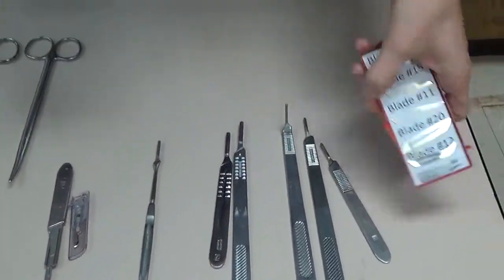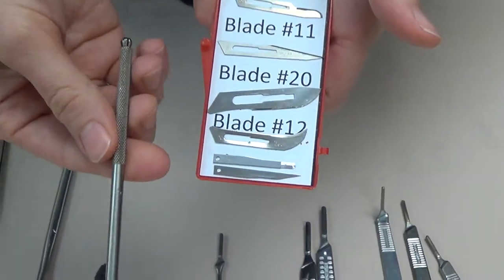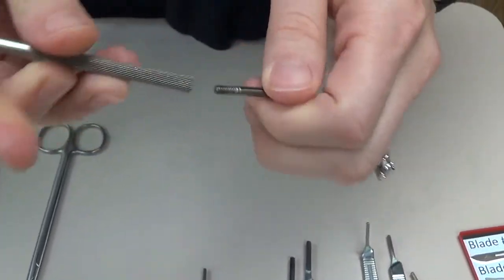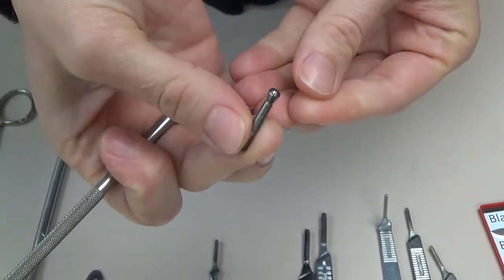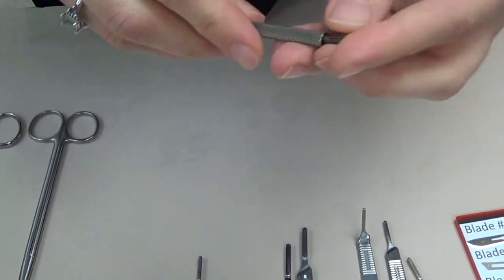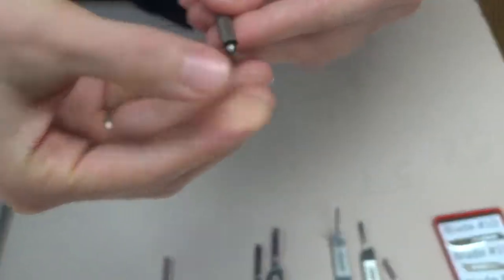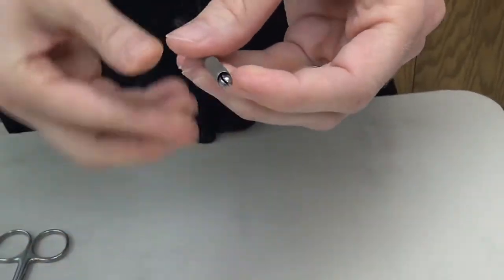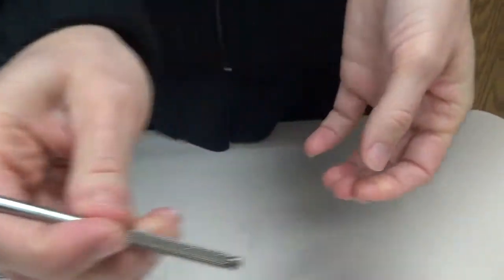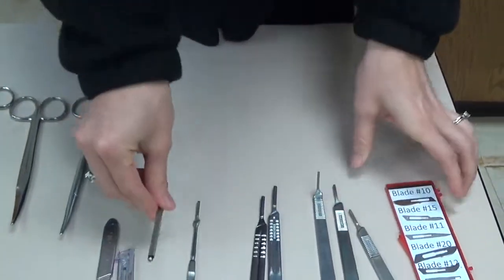Now those beaver blades that we showed you at the bottom here will fit on their own special handle, which is called a beaver handle. This beaver handle actually has two pieces. So it has a screw in the end of it and then the handle portion here, which is round. So what you will do is you feed this in, and then you would take one of those blades and feed it in, and then you will tighten down that screw until it's tight. And then you will be able to make your incision with that beaver blade housed inside that beaver handle.